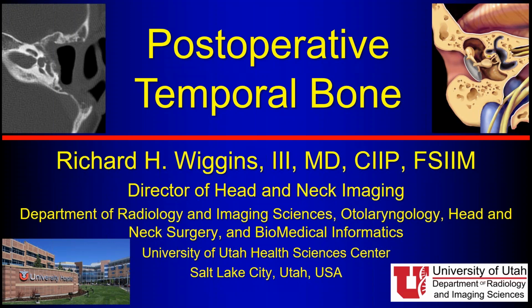There was one question about DWI. Does DWI have any role to distinguish residual tumor recurrence from post-inflammatory changes or fibrosis in the 3 years post-op? I think DWI has a huge role if the patient has a cholesteatoma. When we're trying to differentiate a small or residual cholesteatoma, whether you're doing a version of an EPI or non-EPI diffusion, working with PROPELLER depending on your vendor, or if you're doing axial or coronal, I find the axial is a lot easier for the blooming that happens around the air cells themselves.